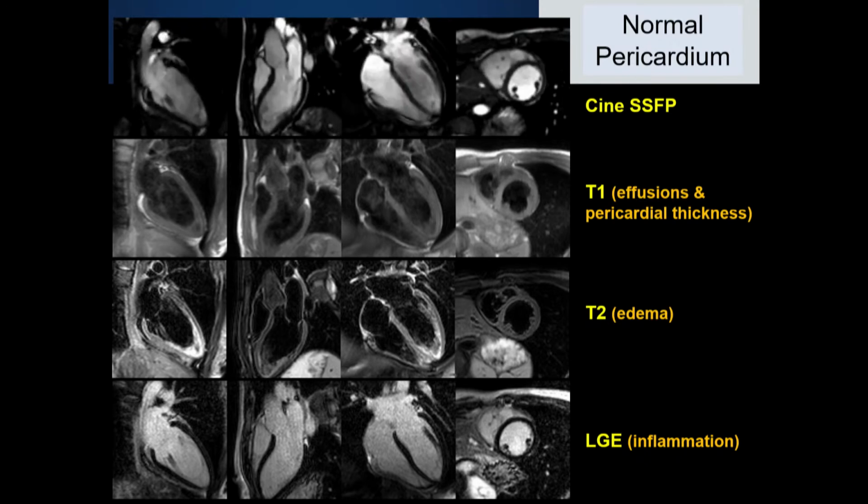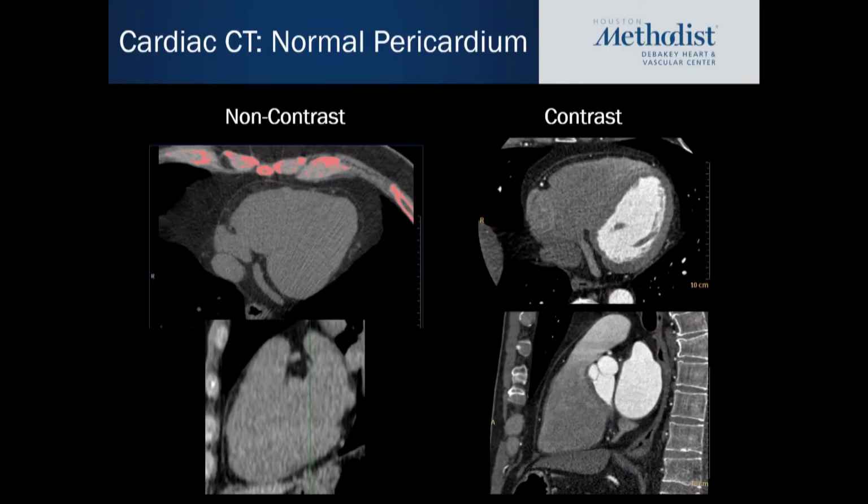But in the images I've shown here, the fact that you do not see any brightness on the T2 or LGE sequences shows that there's no edema or inflammation in this particular patient's images. Just remember this, that this is what normal looks like.